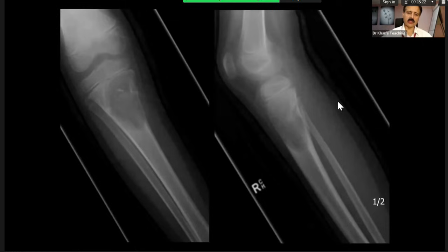And classical location of aneurysmal bone cyst is metaphyseal, and simple bone cyst classical location is metadiaphyseal, here central. And then there is a concept of migration of cyst, where it migrates towards the diaphysis as the child grows. So that also goes in favor of it. But in the exam, nobody will mind if you say both of these things.